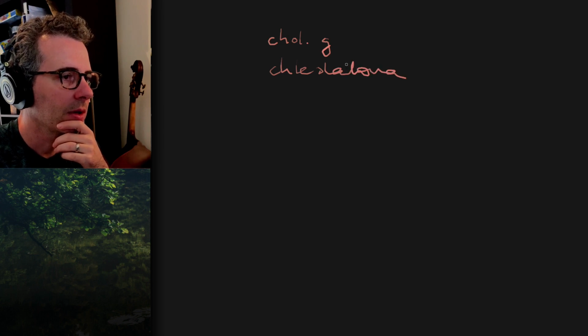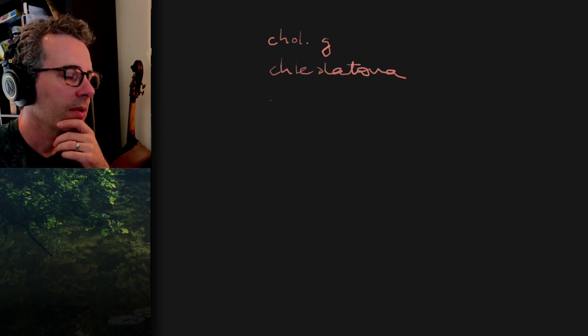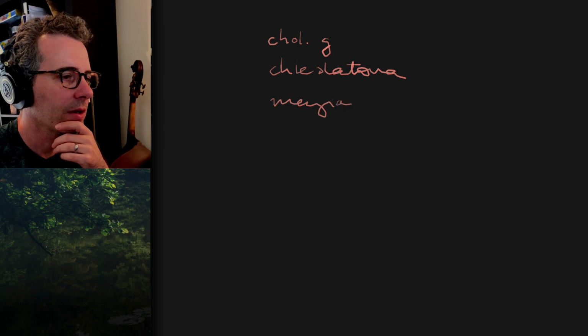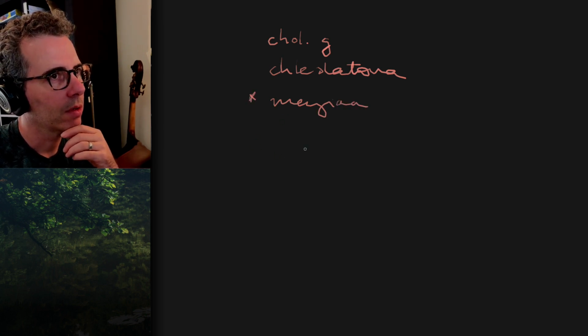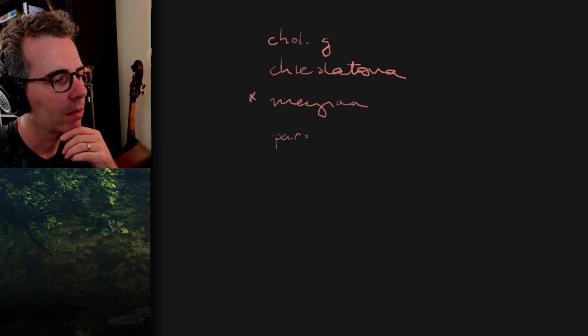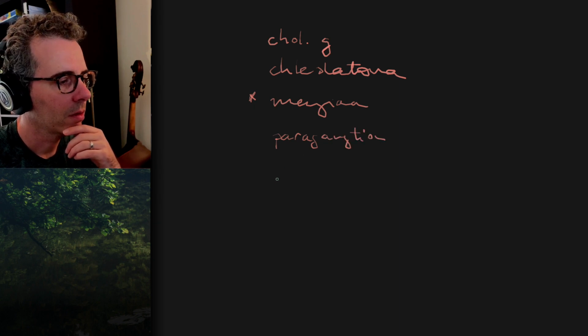Yep, maybe. But I don't really like that for this. What else did you want? Paraganglioma. What else? And then I was going to say a chondrosarcoma.